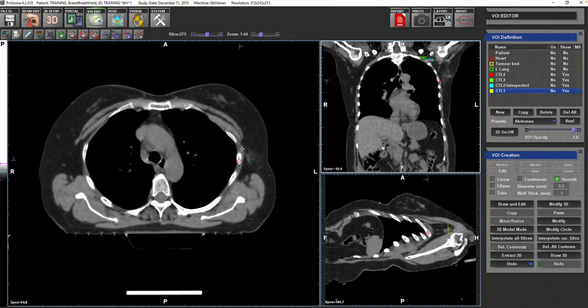With the CTL1 axillary node, you go down to rib number 4, or sometimes rib number 5, based on where your lymph nodes were located. If you have a very low lying lymph node, maybe you can go to 5. If you have one higher up, you can go to 4, and that would be fine.